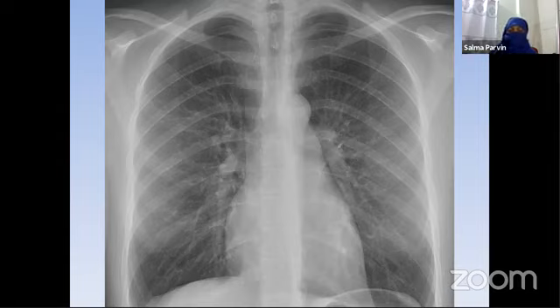And what we see really in the chest X-ray is the component we have at the lung fields. Definitely we have the cardiac shadow, the vascular markings, the bony thorax, part of the shoulder girdle here, a very small part of the upper abdomen, and of course part of the root of the neck. Let's go into details.